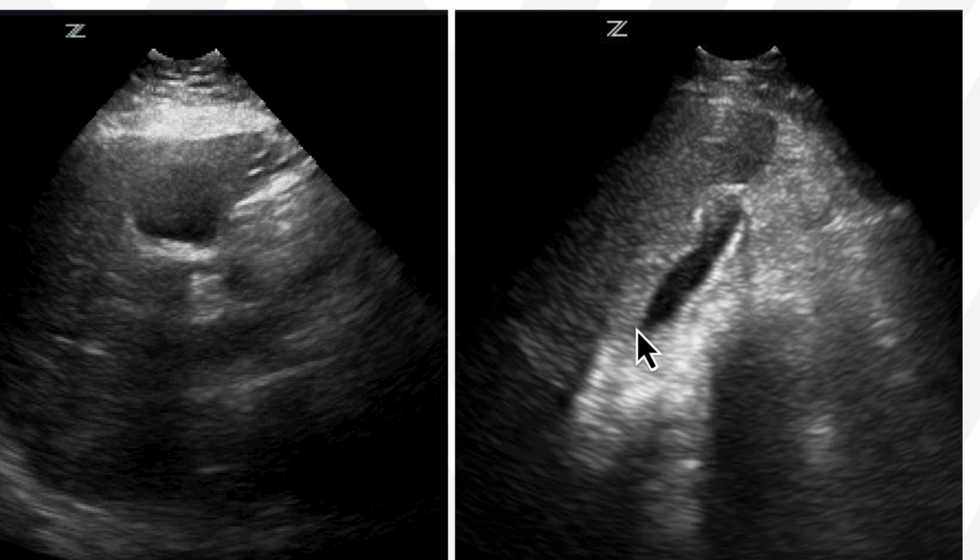And then in this example, we see this gallbladder, it looks a little bit contracted, but then we see this wall looks like it's poorly defined, and it looks almost like the wall just gradually fades into the liver, and that's because this wall is thickened and inflamed. So this is gallbladder wall edema, and that's one example of what that can look like. We'll look at some other examples here as well.